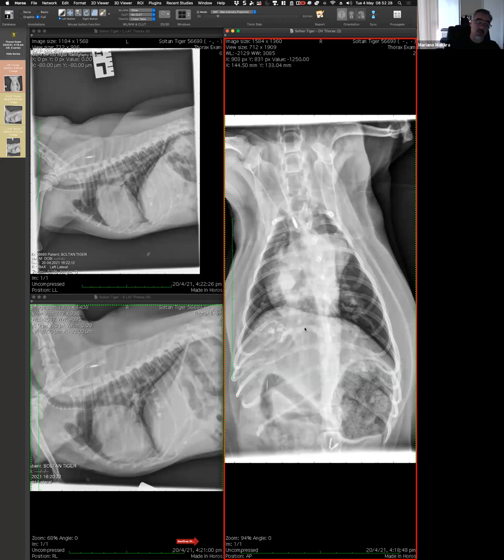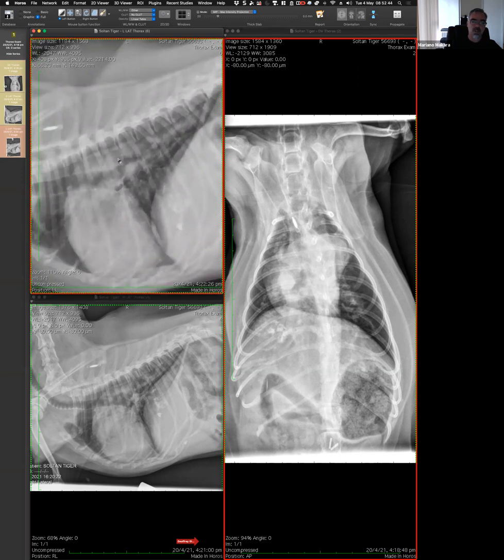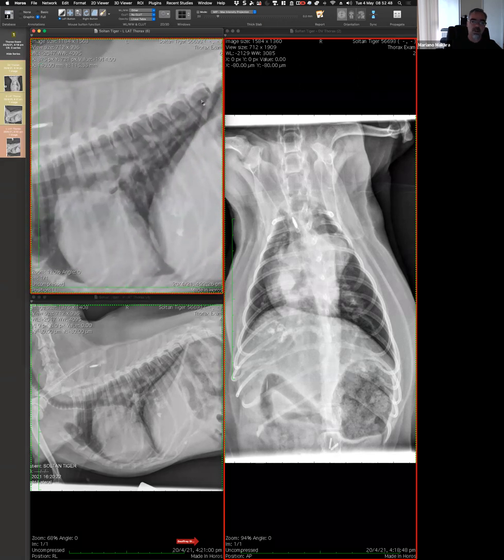And to be very honest, there is a time where you push your model. Makes sense? So it doesn't fit perfectly. You push it a bit because everything else fits so well. And what fits very well, and I remember seeing it in cases, is this undulating contour, and this is very classic for pulmonary arteries. So if that doesn't fit perfectly, I push it, I make it fit, just because all the rest is so clear. Okay, thank you.